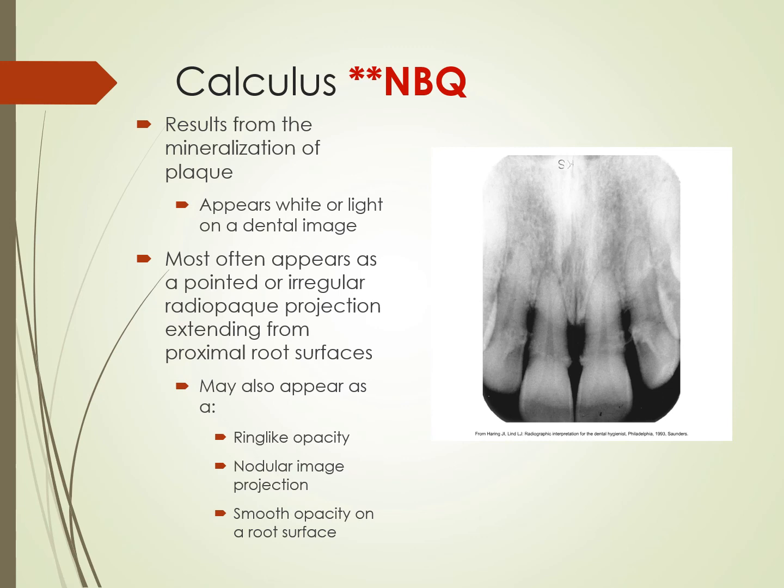Your saliva actually mineralizes the plaque if it's left on the tooth, and the longer it's there, the more dense it becomes. And as we know, if things are dense, they start to show up on x-rays. If they're not very dense, like plaque or early calculus, then they don't show up, right? So even though we might not see calculus on our radiographs, that doesn't mean they don't have calculus, okay? Just keep that in mind.